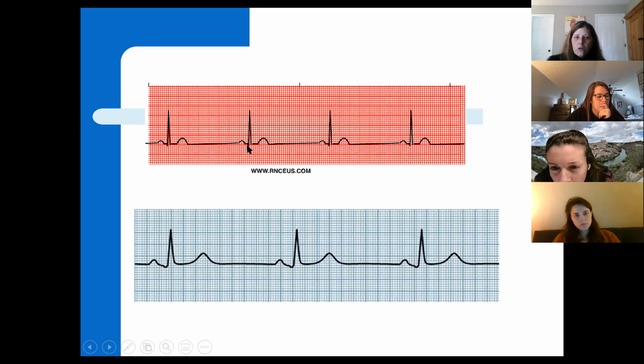On this one here, you see where the Q wave is a little bit more of a defined deflection. Well, we have that deflection coming off of this isoelectric line here, and that's Q, but it's a little bit easier to see, whereas this one's a little bit harder to see. You almost can't tell the difference between negative deflection and the upright going to the R, right? It's pretty tight in there. But this seems to be just a little bit wider. But this is sinus brady again.